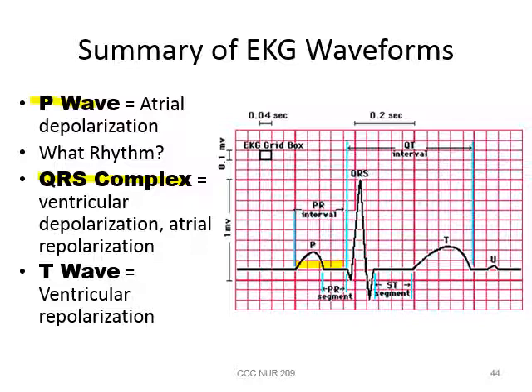When we look at the QRS complex, we're looking to measure the length of our QRS complex and looking to see if it's less than 0.12 seconds. With our PR interval, remember, it should be between 0.12 seconds and 0.20 seconds, so basically 3 to 5 blocks.